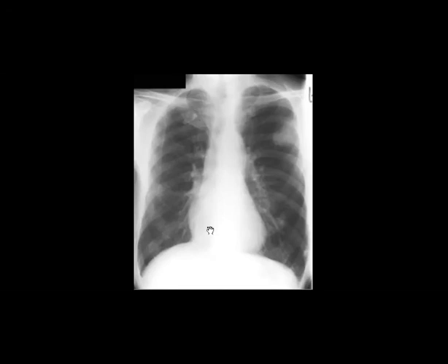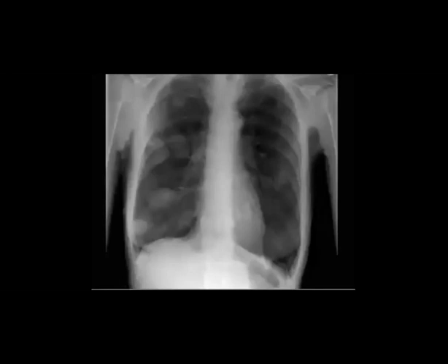I know that, but for the exam they like to show you something like this, or at least you think about it. Let me show you something here. So, for example, here, this patient has multiple lesions, which are what is called cannonball lung lesions.